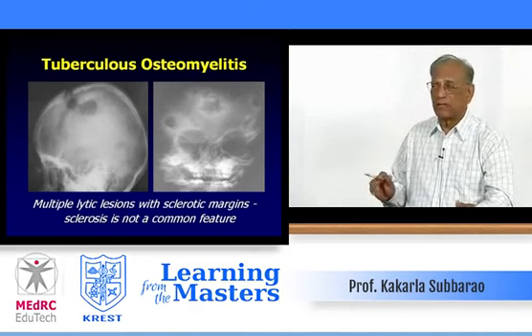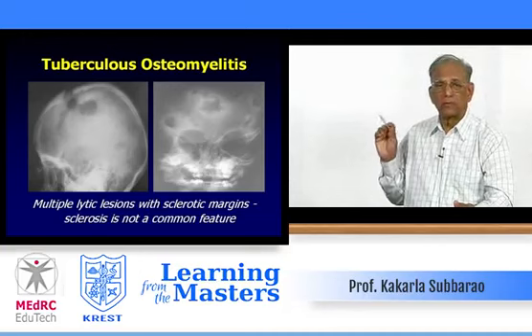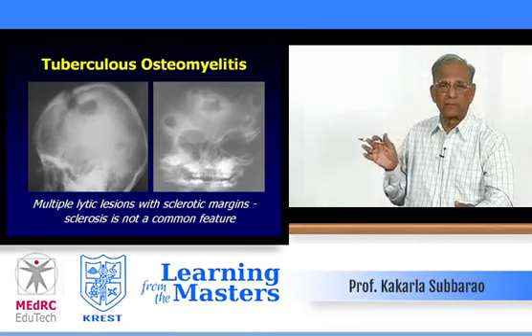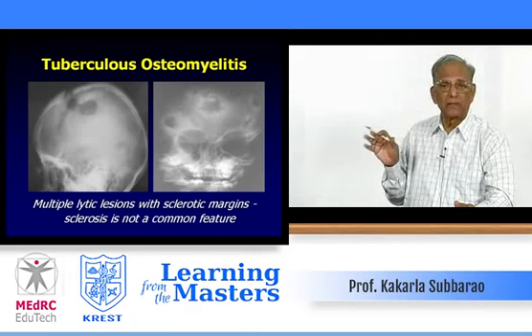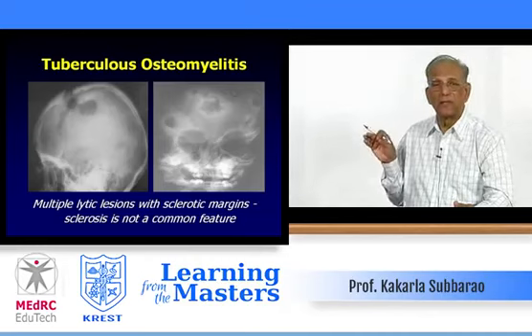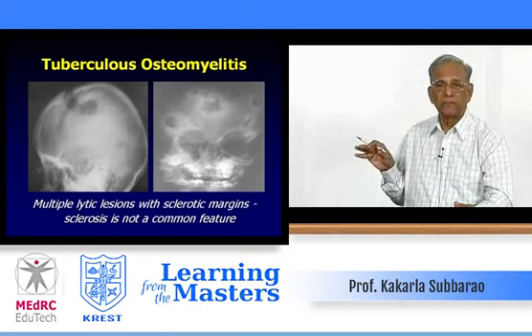The one on your left side, you see the tuberculosis of the skull with multiple lytic areas, and the frontal and parietal bones are very commonly involved. Whether it is hematogenous infection or from the sinuses, whatever the reason may be, the lytic areas are characteristic of tuberculous osteomyelitis. The one on your right side, particularly in a child, in an infant, cystic tuberculosis is common.